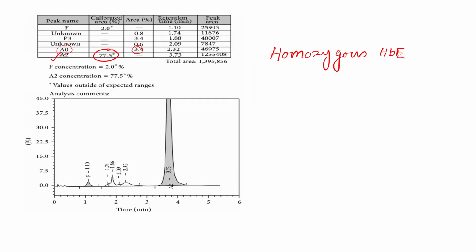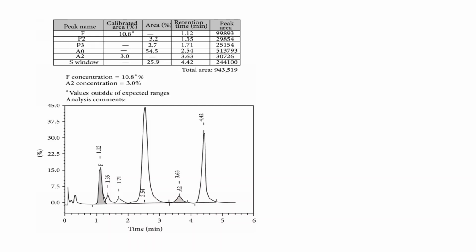So mostly we have already discussed the heterozygous variants of beta thal and the homozygous beta thalassemia, and also the different interpretation of HbA2. Hopefully you have understood that. So now we are moving forward to the peaks other than HbA2. Again, whenever you get an HPLC, your approach should be similar. There shouldn't be any difference in your approach. First, you have to see the HbA peak, followed by the HbA2 peak, and thirdly, other hemoglobin peaks.